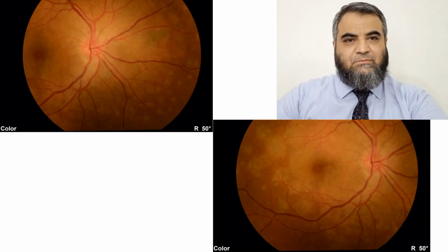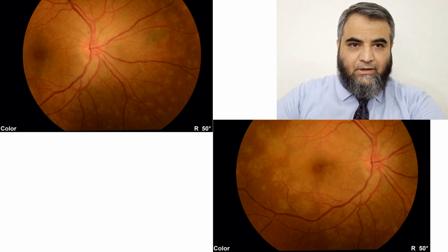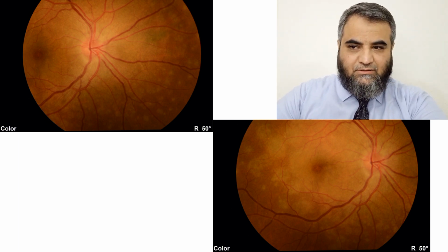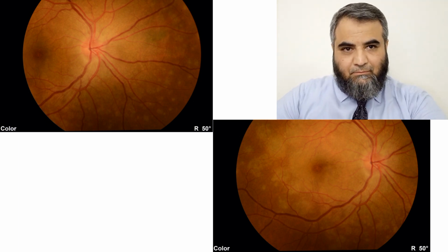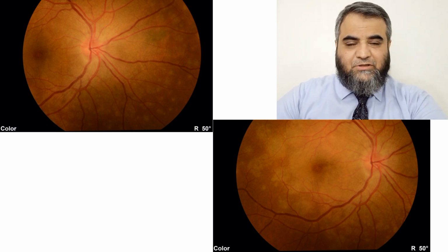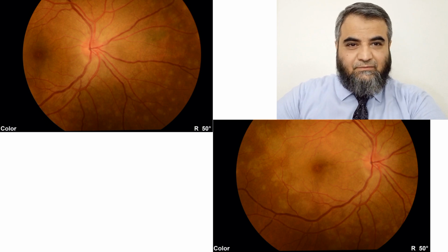As I mentioned, this disease affects the retinal pigment epithelium and the capillaries in the choroid. Here again we are showing different patches, yellow-colored lesions with indistinct margins in the right eye, occupying the macular area as well as the nasal side of the retina. Patients usually present with floaters, mild discomfort, decreased vision, and scotomas. These are the usual presenting features.